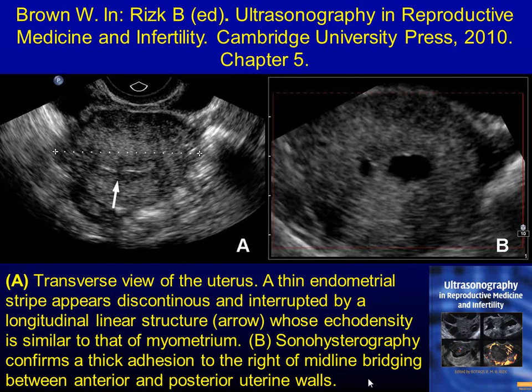The third issue that you can find inside the uterus is scar tissue. So this lady was classic: she had an early pregnancy, miscarriage, DNC, still bled, another DNC, comes back with amenorrhea. So what's your best guess? It's Asherman syndrome. Asherman syndrome means that the uterus walls are stuck. Simply, the uterine cavity is a very small cavity.